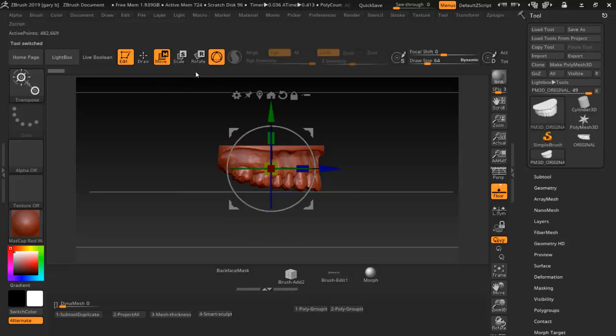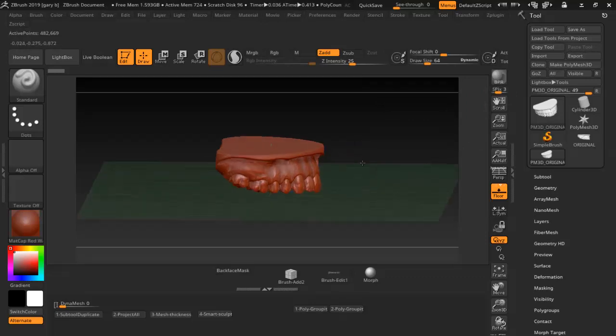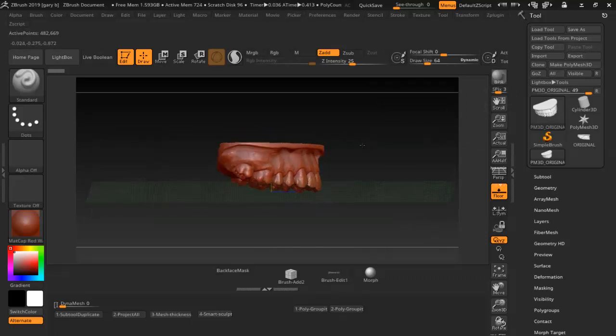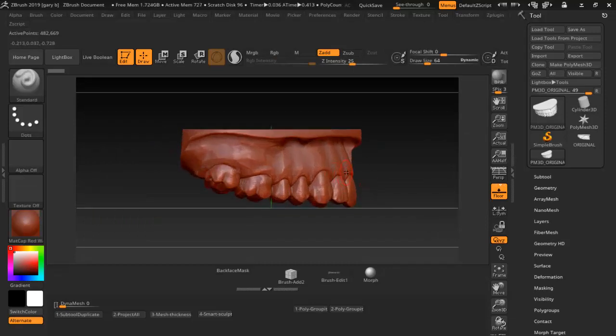All right, I'm going to be selecting this DynaMesh, and before I do that, it's going to ask me to copy this. But before I copy this tool here, because once I copy this, the script will also paste it, I want to make sure that when I copy this, the paste will actually be activated. I need to go ahead and reduce the polygon count because I want to try to keep as much detail as possible. I want to keep the teeth. I'm going to get rid of the rest. I'm not even going to explain that, so you'll need a little bit of knowledge here.